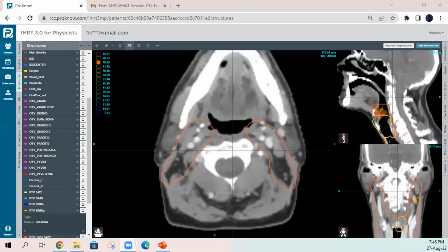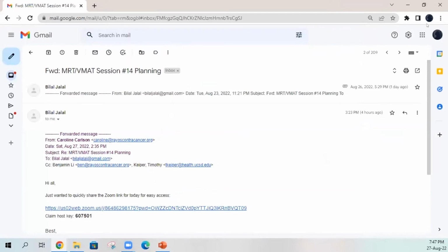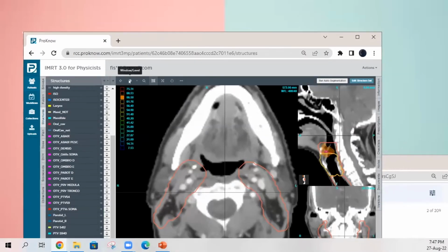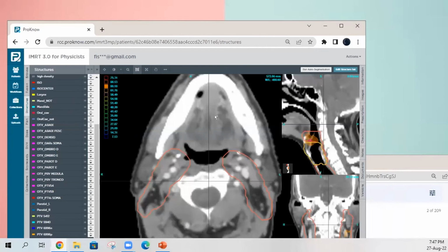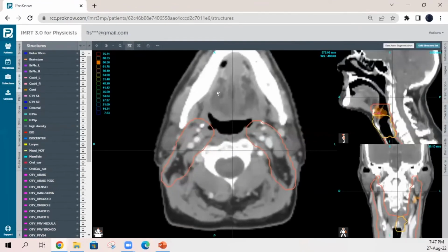So I hope you can see my screen. Yeah, you're good to go now. Excellent. Okay. So this is one of the plans submitted. I hope I can hide this one. Oops. I think it's clear. You can see the screen. Can you maximize the window? The browser? Yeah, but I need this to disappear. Okay. Now it's fine.